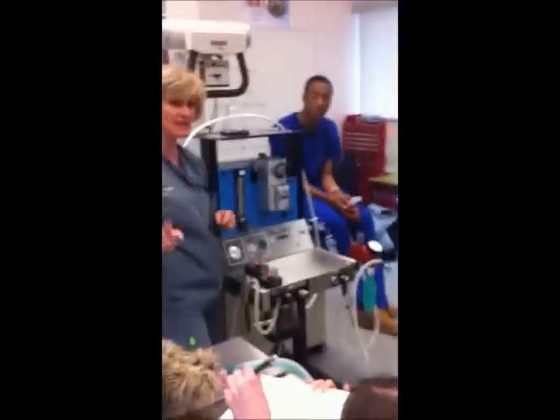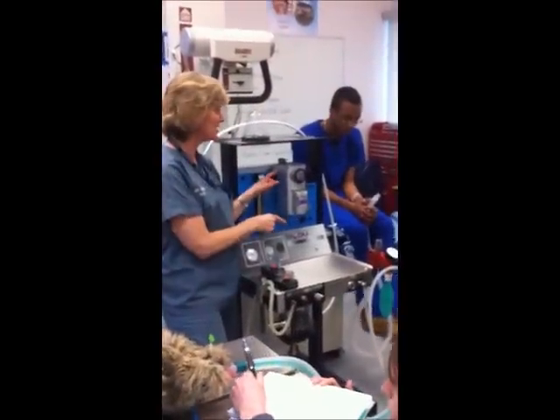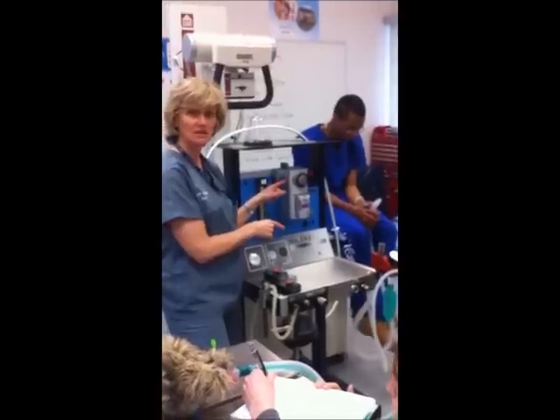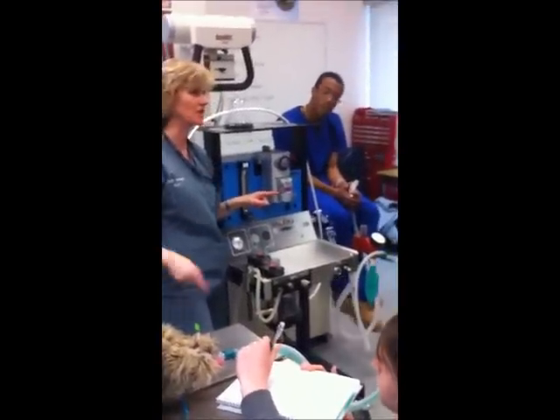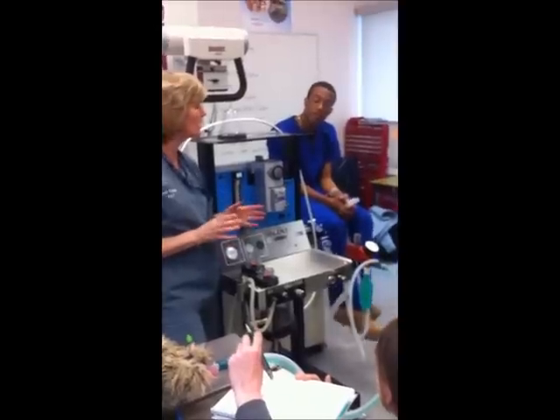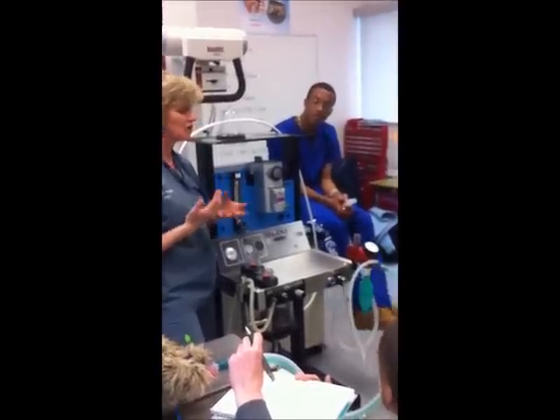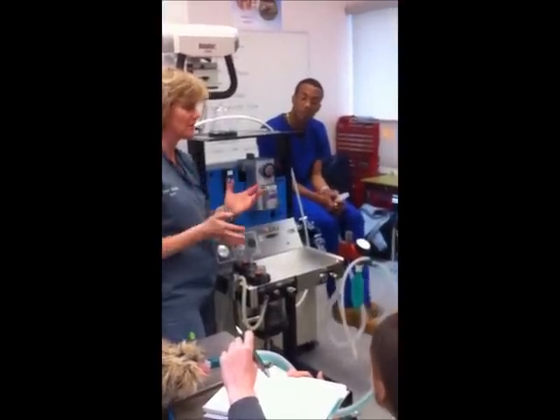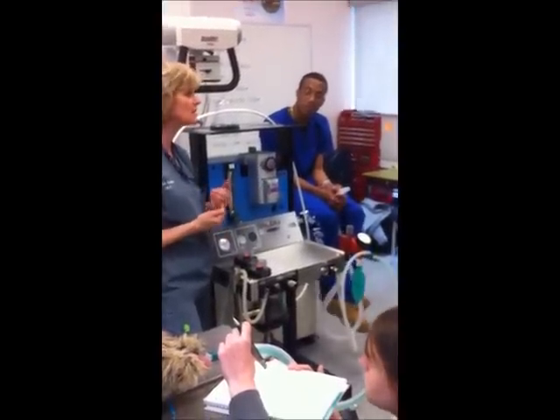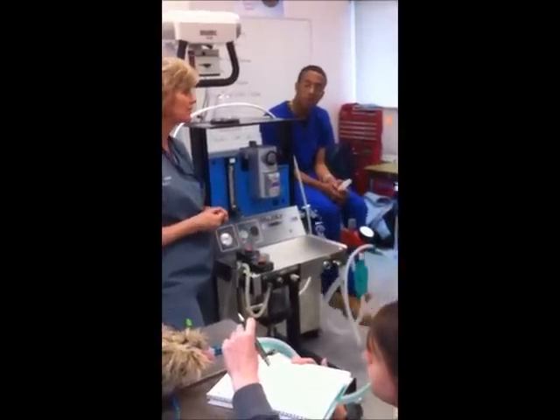The difference between this and what we were just talking about with our respiratory arrest is I still have my fresh gas. I want anesthetic going into those lungs so that the animal inhales it. But I would not do that for too long. If I've given my animal a couple of bags and things are not changing, I'm going to start wondering about my anesthetic equipment, the health of my animal, that type of thing. But that is another scenario where we might bag the animal.